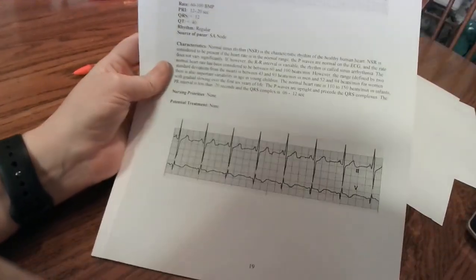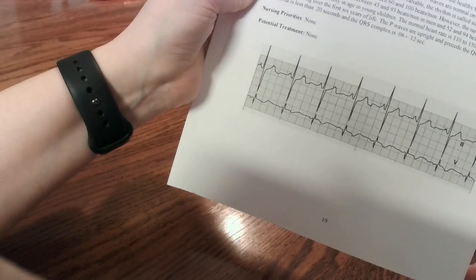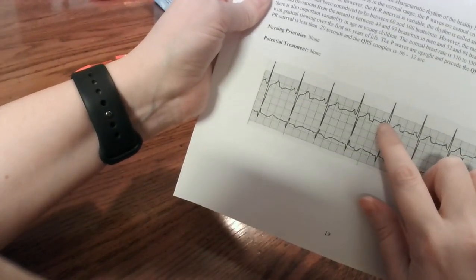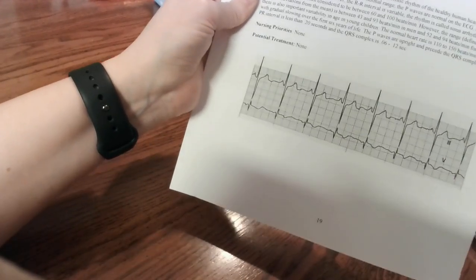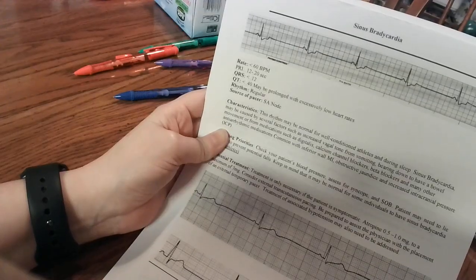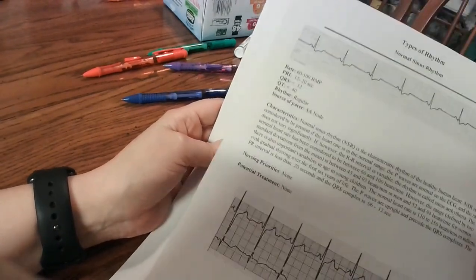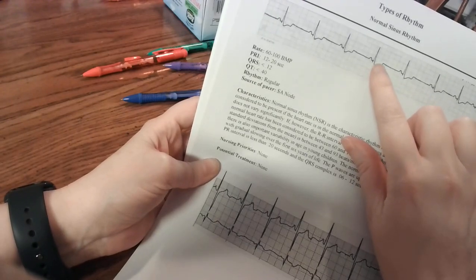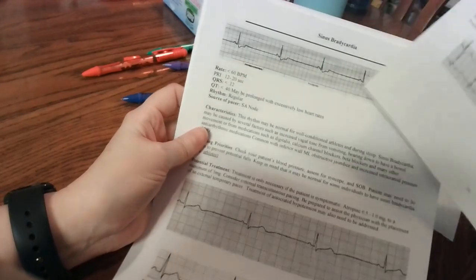And of course, you can see that one on the bottom too. Right there, it has a higher T wave, which is indicative of hyperkalemia. And then see the P waves are really funky looking here, but they're still P waves. So there's that. I should have mentioned this on the other one, but the top one here has some ST depression, because see how the segment between the S and the end of the T is lower than the baseline? So that's ST depression. Still sinus rhythm, but ST depression.